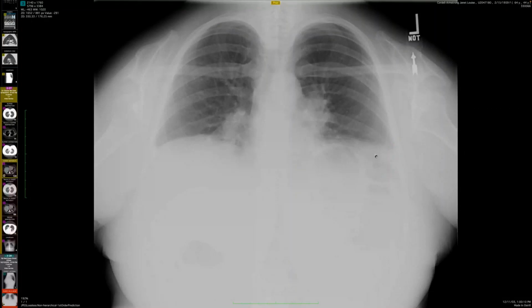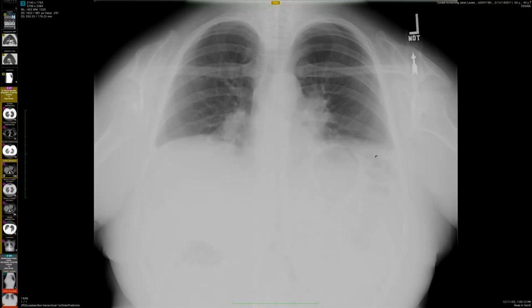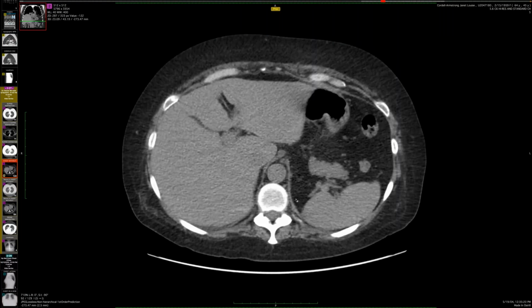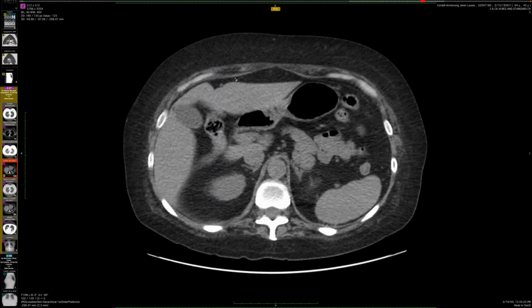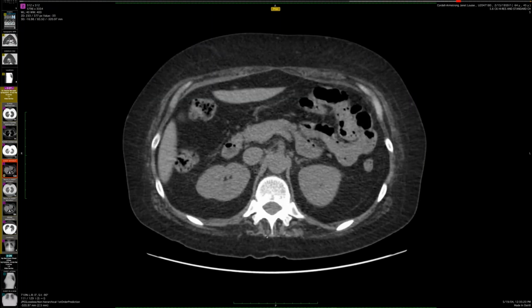Mixed connective tissue disease, a component of lupus, and a myopathy related to lupus. This person has extremely low lung volume. This is from like 2004 or something like that, a long time ago. If we look at a CT scan in that era, we see a decent thickness of diaphragm muscle posteriorly on both sides, on the crura and posterior diaphragm, and anteriorly the diaphragm is a little bit thin on the left, pretty close to normal on the right.